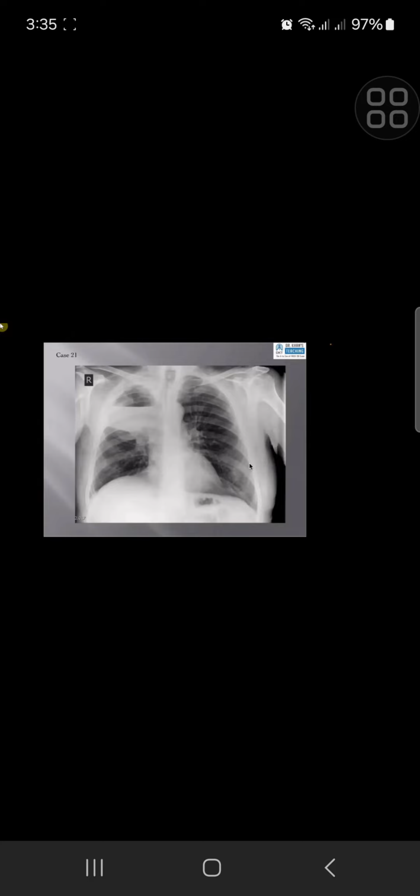So I'm provided with a frontal chest radiograph in a skeletally mature patient. I am seeing opacification at the right upper to mid zone. It is bounded by the transverse fissure inferiorly, and looking through the opacity, the upper margin is rather straight and horizontal in configuration.